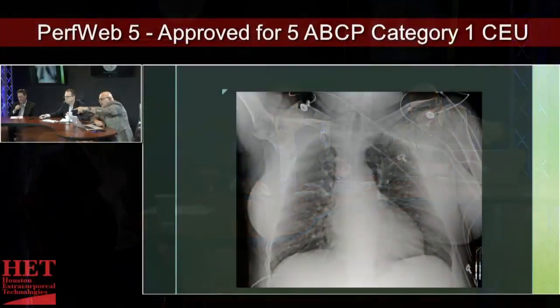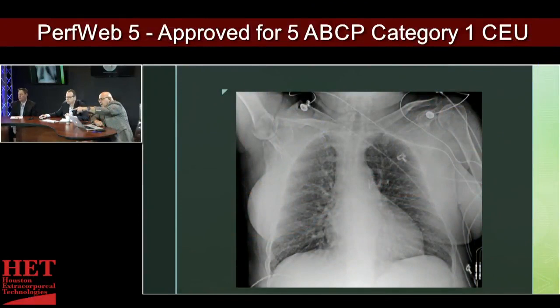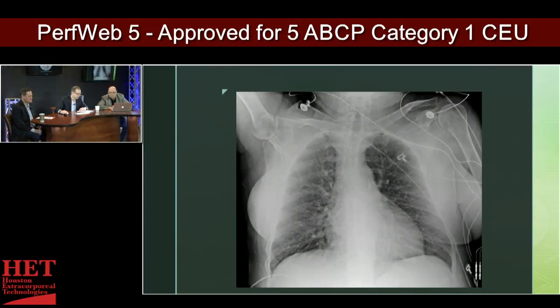Different people have different orders. If you ask a radiologist, they'll have their own specific way, but that's how I do it. Well, this looks like a lady. And it looks like her right arm is up. She's got a pretty scrunched little neck. She might be a little overweight. Yes, and that would be noted in the soft tissue portion of the exam. But yeah, this would be somebody that you would be concerned about their anatomy being a little bit skewed.